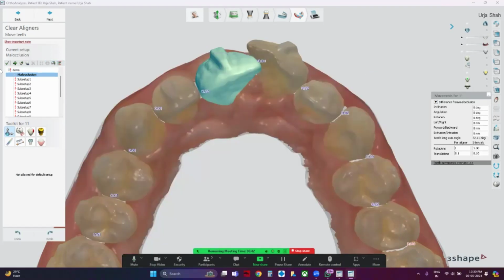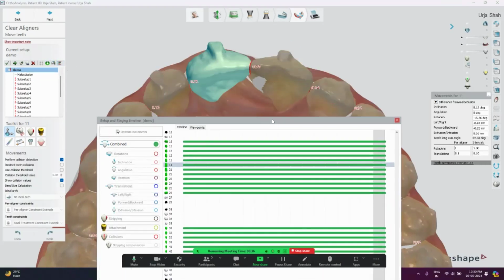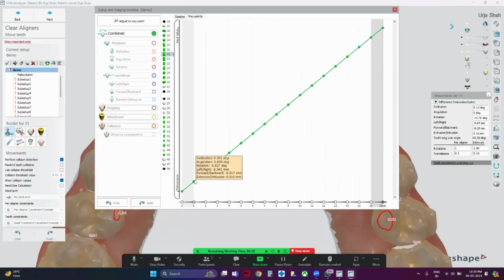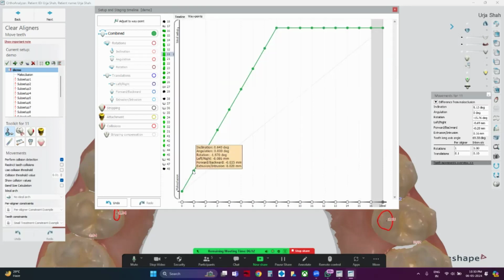So let me still go, so that something does not work. Okay, so I want to start my 1-1 immediately as the aligner starts. Let's see, it's undergoing a rotation of 0.9 and I want to take it to 1.5. So I will go to timeline, and 1-1 I will make it half, so that's 17. So let me get it to 8 and go to waypoints and check again.